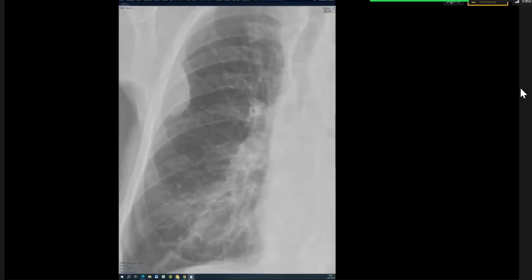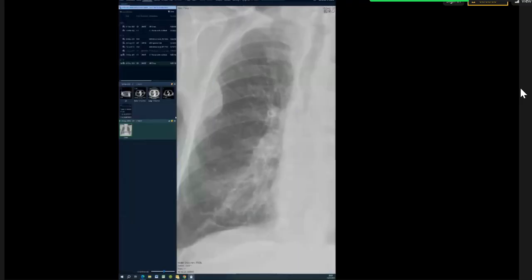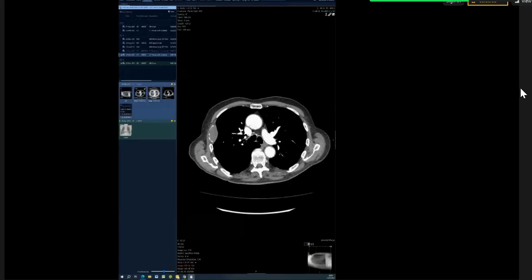And this was 5 minutes ago, a repeat of the same thing, and I'm glad I checked you. You made the same mistake again. Yes. You have to pick the bone destruction. Okay. If you pick the lesion. Yes. And I could not appreciate that, but I will look into practicing it.